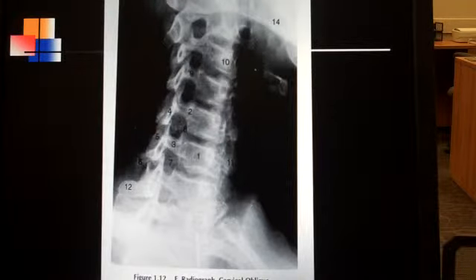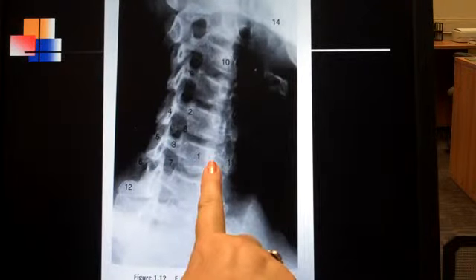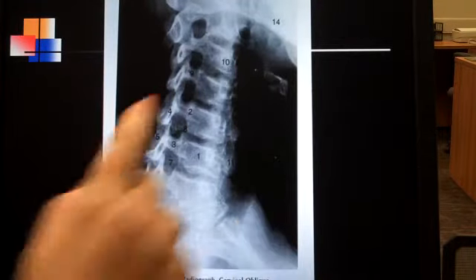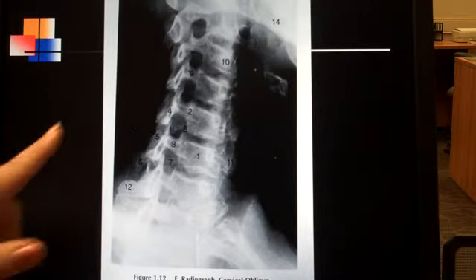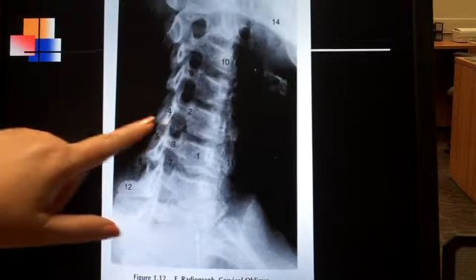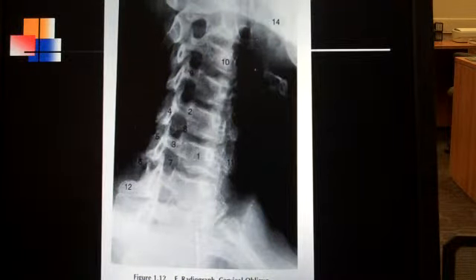cervical oblique views. You have a left anterior, a left posterior, a right anterior, and a right posterior. We know which one is which by the location of the marker and what it is closer to. If you had a right marker on this side, closer to this vertebral body than to the spinous process, that would tell you it is a right posterior oblique. However, if you had a left marker on this side, closer to the spinous than to this vertebral body, that would tell me I have a left anterior oblique. On either of those two views, you are looking at the left IVF.